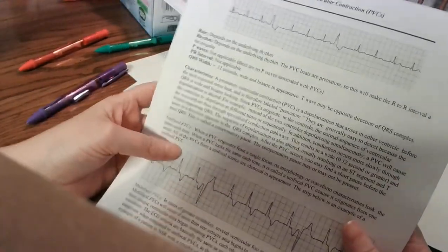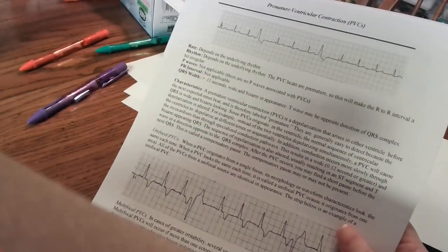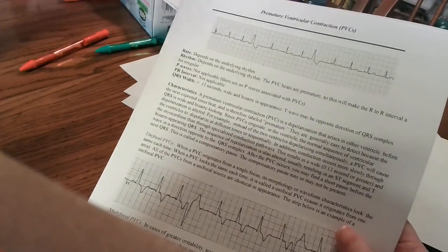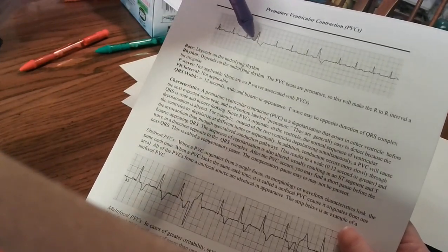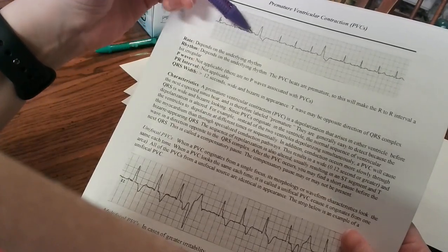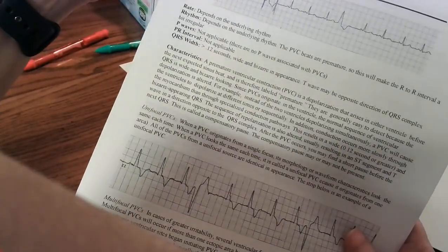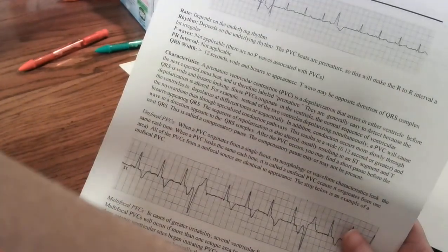Okay, and then PVCs. PVCs are just like a premature atrial contraction, except these come from the ventricle. So they'll have whatever their underlying rhythm is, boom, boom, boom. It could be AFib, it could be A flutter, it could be normal. It doesn't really matter. And then the ventricle gets real excited and is like, I'm going to go right now, and so it just gives an extra beat. They always look weird. Remember on the PACs, the QRS was still normal, it was just kind of early. On the PVCs, it's always going to be this wide, complex, really Q to T kind of situation.